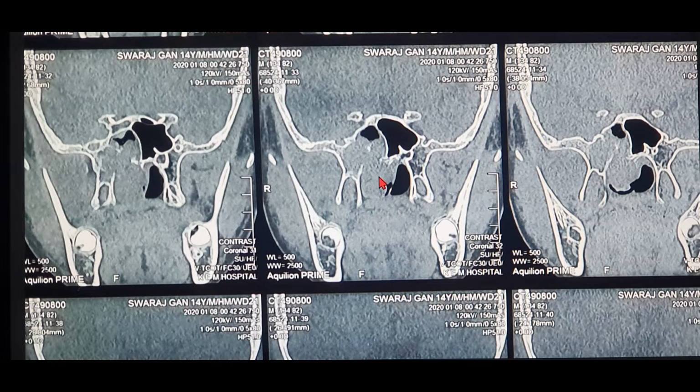Although JNA has attachments to the nasal septum, the nasal mucosa, the roof of the choana. So it enters the sphenoid sinus not through the sphenoid ostia but through destruction of the floor of the sphenoid sinus, or you can say the roof of the choana. So as you can see, the pterygopalatine fossa, which is around here.